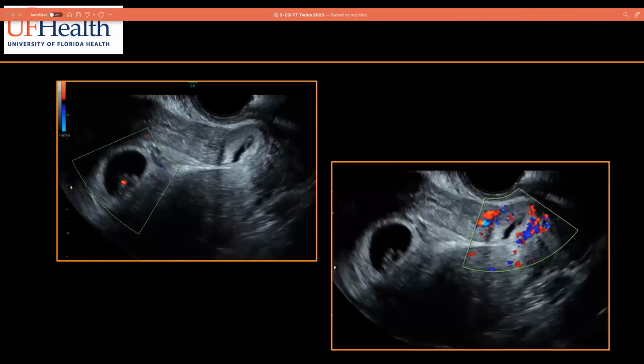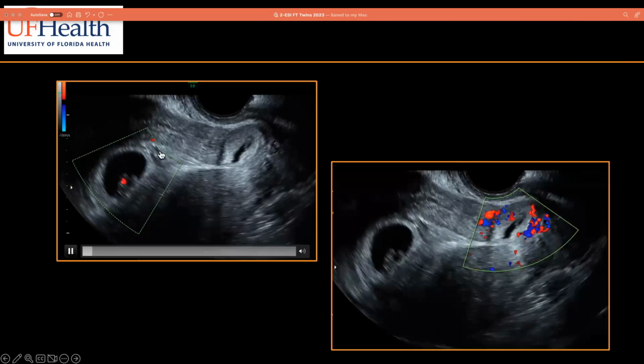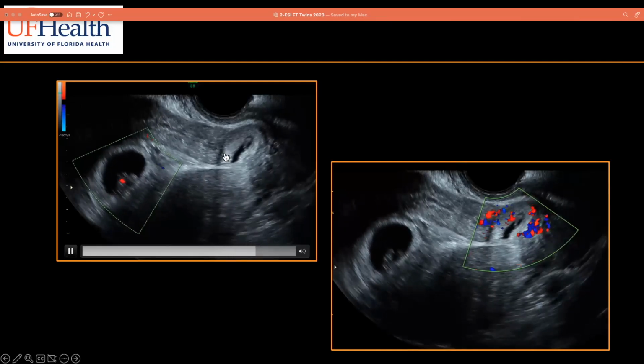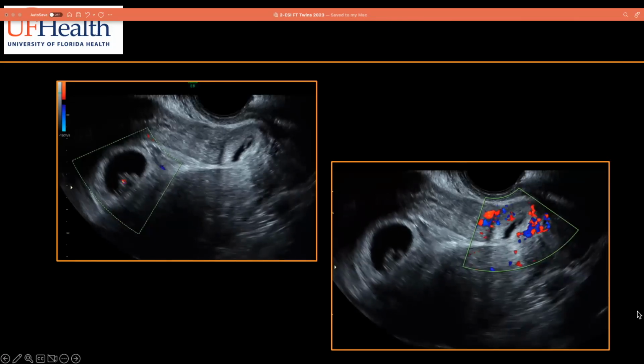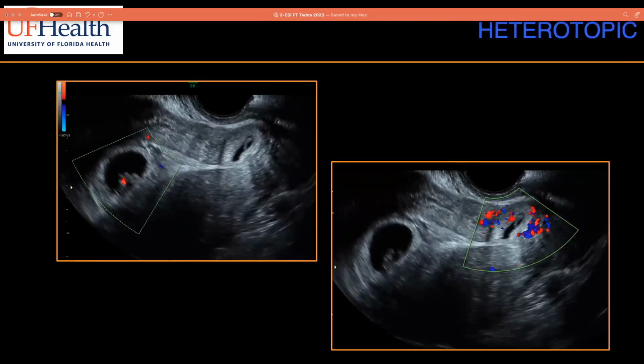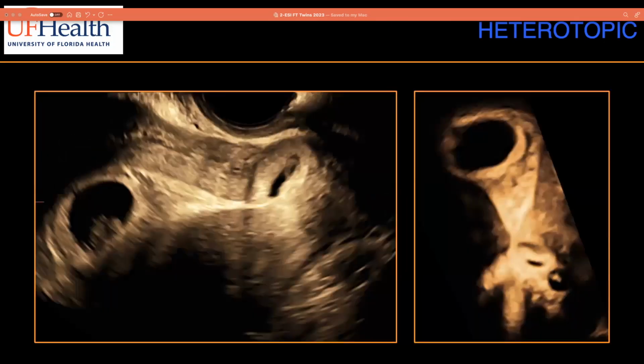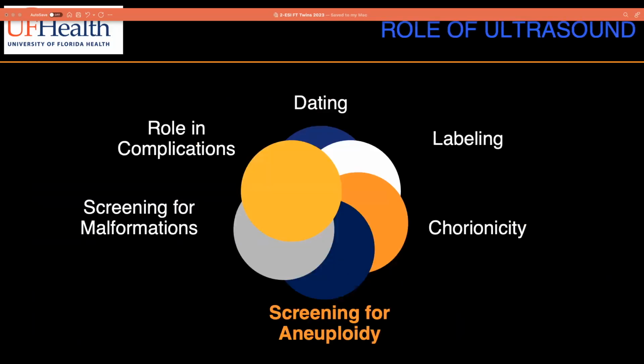And the latest that we've had a few years back was this patient with a prior history of C-section who came in with pain and bleeding, clearly had a gestational sac, viable fetus, but then this is the uterus sagittally on transvaginal scan, and here is her scar, and you can see that there is another pregnancy in the niche. So this was a heterotopic gestation with an intrauterine and a C-section scar pregnancy. And here it is again on 2D and using 3D reconstruction.